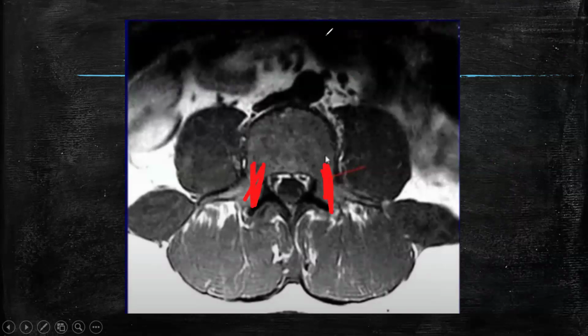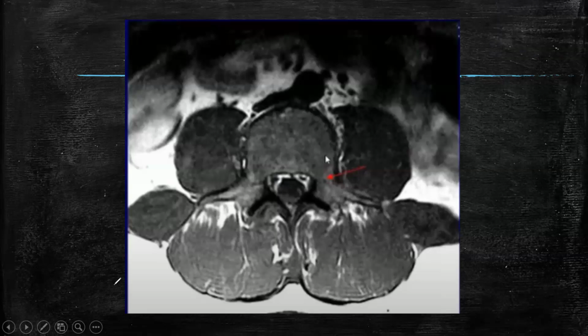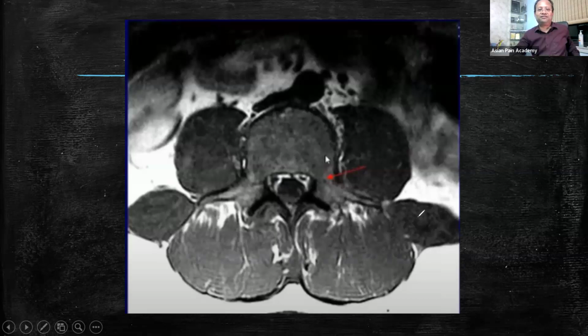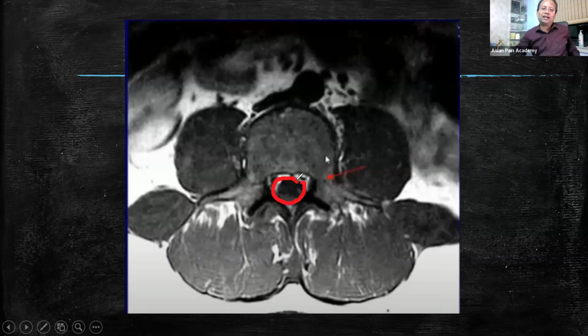It's okay. And this is what, T1 or T2? Black. See the CSF. T1. Black. Yes. This is T1. The whole black ball should be there in T1 only.